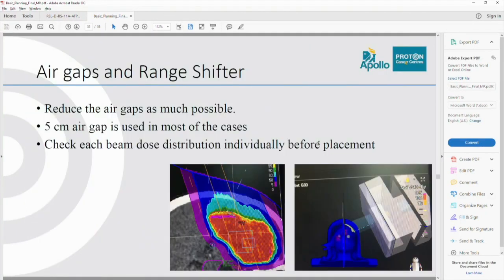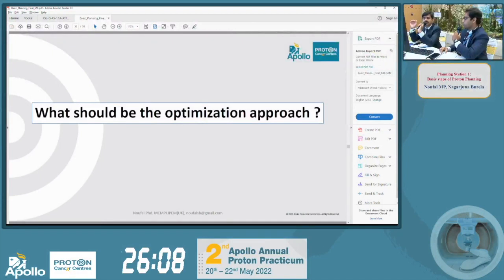One basic. Okay, we are using proton RBE 1.1. We give prescription like 50.4 gray equivalent in 30 fractions. So whether this 1.1 is taken into our systems, how do you take this? Can you tell the audience? Yeah, you say gray RBE because we already took this into account, it's in the system itself. So you prescribed in terms of gray RBE. So RBE 1.1 is already multiplied in the systems, and it's already taken into account.